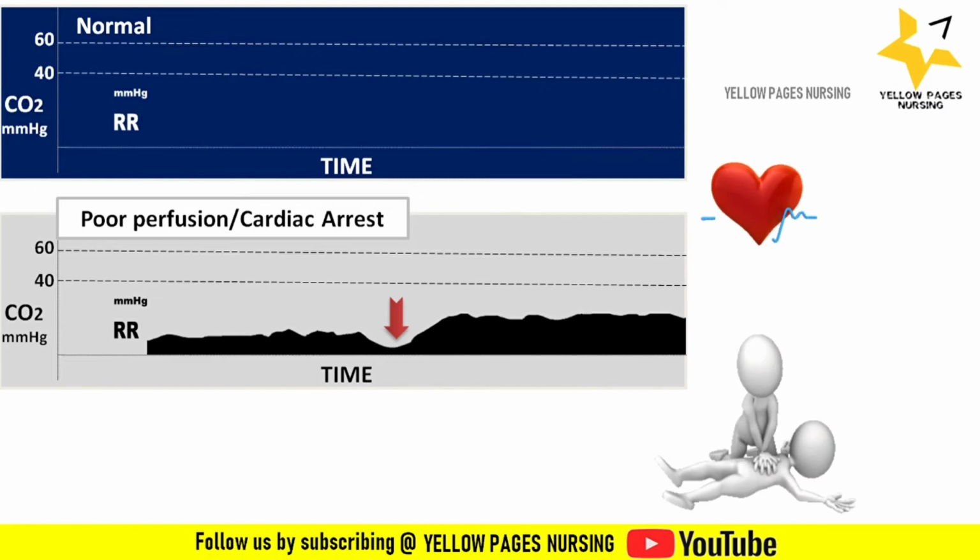If you notice this image, there is a trough formed in the center of the capnogram. This trough is formed when the first rescuer takes the hands off during CPR and the second rescuer takes the turn for the compressions. After the second rescuer takes the turn for the compression, we can notice the elevation in the waveforms.